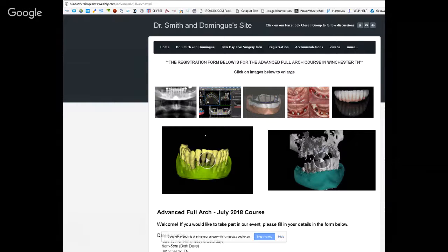So initially, I was doing a lot of implant custom abutments with cementable crowns or cementable full arch bridges, and I've tried various different techniques to either do zirconia over zirconia, or zirconia over another material. I can't think of the name off the top of my head. And then acrylic over this material, which is fantastic. This is a cobalt chromium milled framework with hand stacked porcelain, or this is a composite. I cannot remember the name of the composite.